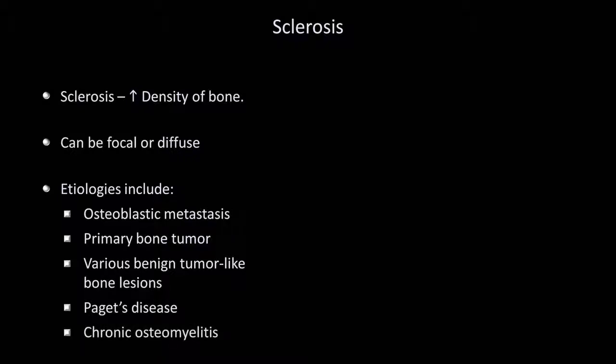and chronic osteomyelitis. As a hospitalist, I feel pretty comfortable interpreting chest X-rays, but sclerotic bone lesions are one time when I always consult a radiologist, because differentiating the various possible etiologies based on radiographic appearance is a very subtle art and requires the experience only a radiologist is likely to have.